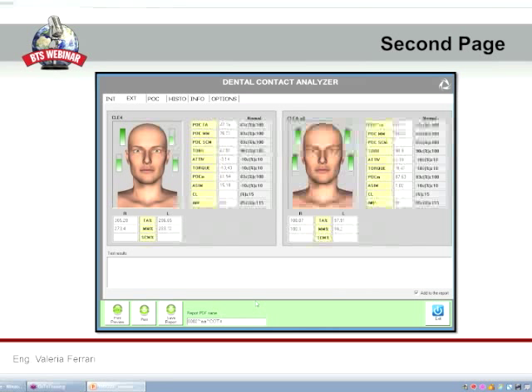In the second page of the report are listed the same indexes, but also the torque index with the same meaning of the torsion index, the active index with the same meaning of the barycenter index, the cervical load, if you use the 6-channel evaluation protocol, and the impact and the asymmetry index that I'm going to explain in the following slide.